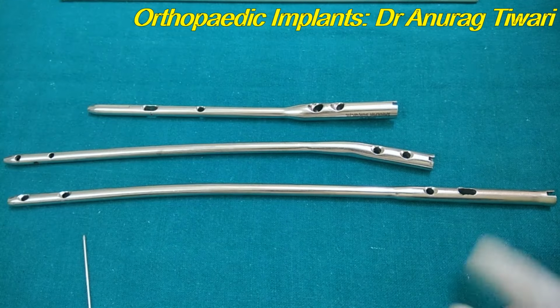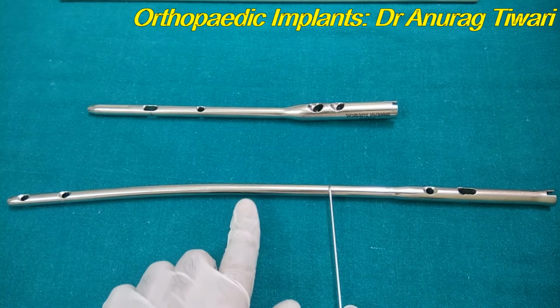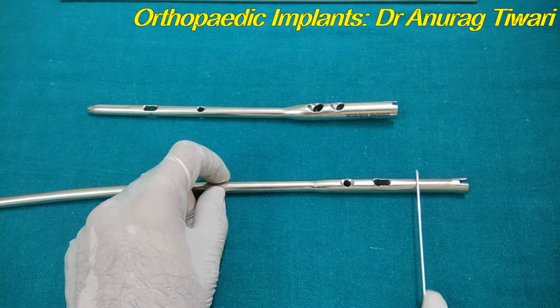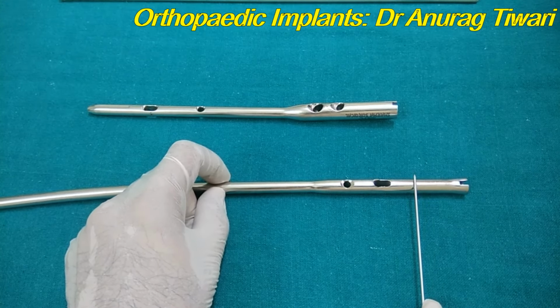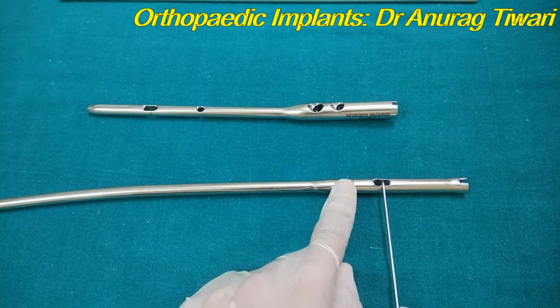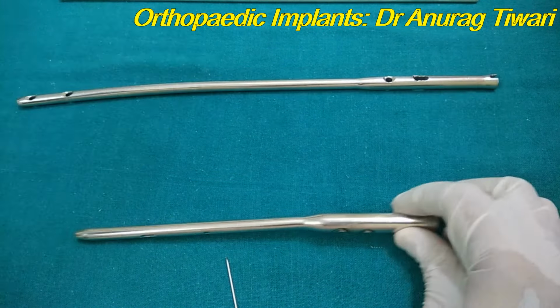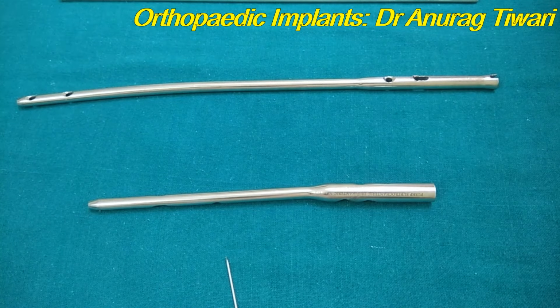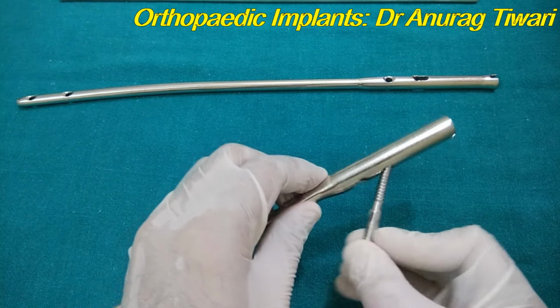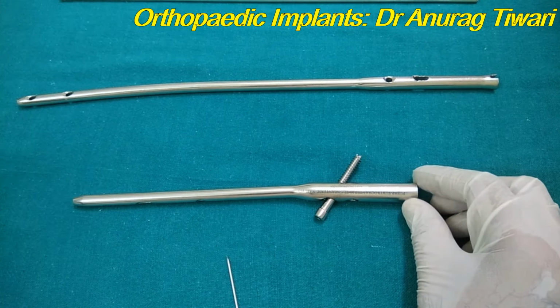Now one thing in the femur: if you are going to treat a diaphyseal fracture of the femur, you fix it with this nail. But if there is a fracture which is above this hole, in the intertrochanteric region or the subtrochanteric region, this nail is not going to help because the holes are quite distal to the fracture. So for this we have the proximal femoral nail, which has now replaced the DHS. This is actually the proximal femoral nail, and it has a different type of screws for interlocking in the proximal fragment.